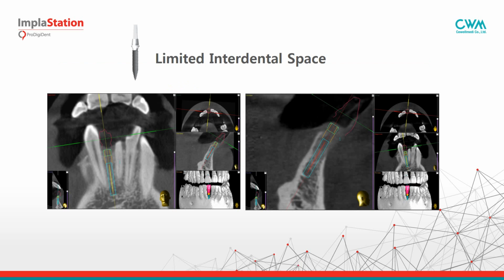This is a very nice, spectacular case which helps to understand how important it is to use surgical guides. Even a very narrow 2.0 mm implant looks like an elephant between the roots of the neighbor teeth.